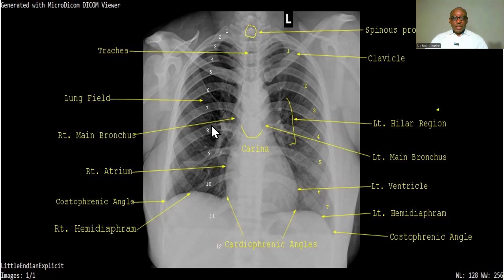However, between 8 and 10 will be acceptable, whereas on the anterior ribs you see about 6, but between 5 and 6 and 7 could be acceptable as well.